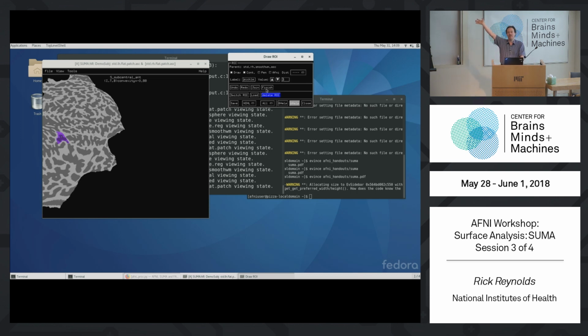Here we could have 17 of them. It could also be an edge node, or an interior node, and one node could be part of 9 ROIs. So this ROI type of data set is actually more complicated. So you do have to take a step of turning this into a normal surface data set. That's all I'm going to say.